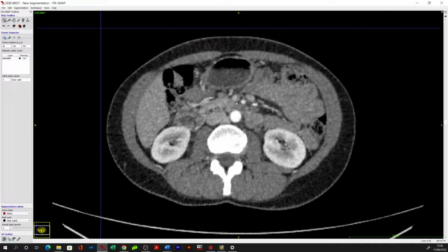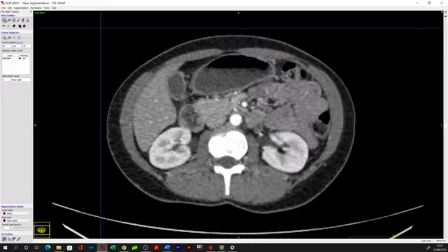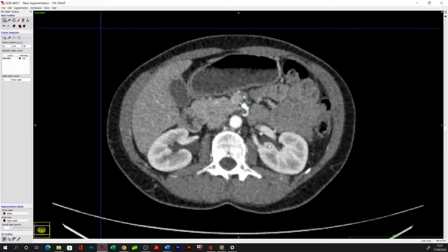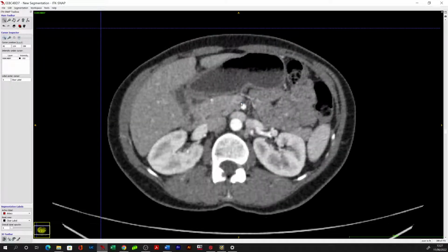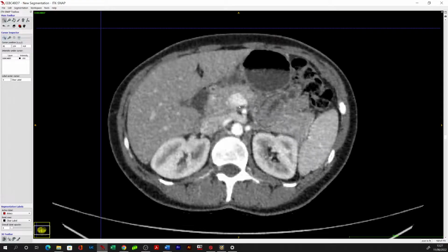and I suspect in this arterial scan, the central veins are going to be slightly more tricky. Which they are, and this is going to be a difficult interpretation.